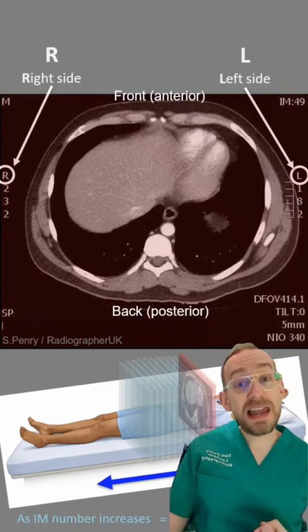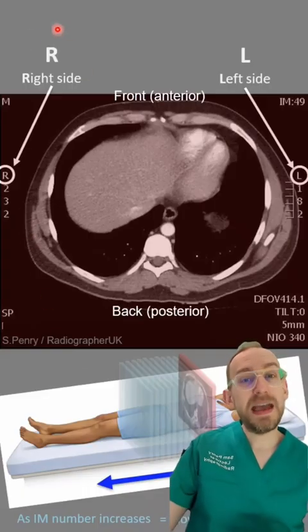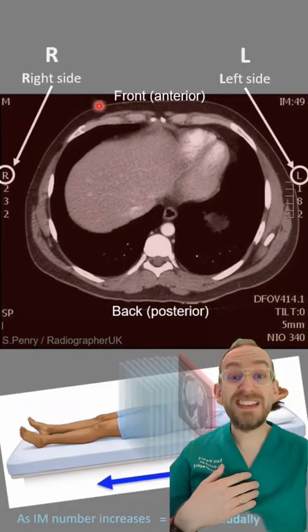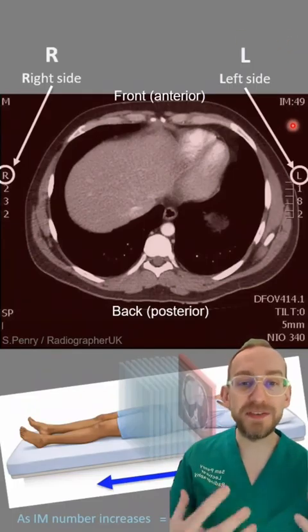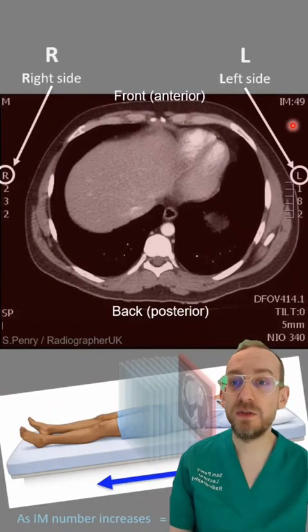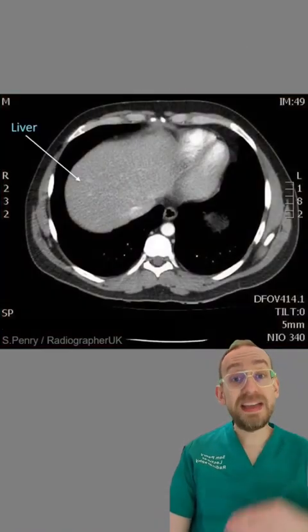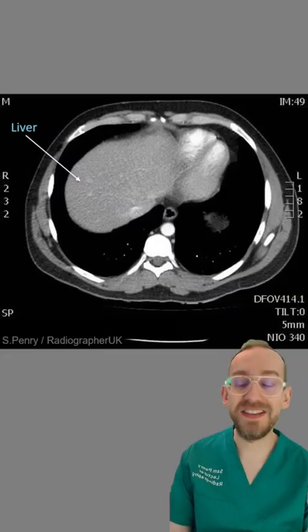Now, if we look at the left-hand side of the image, this is actually the patient's right side. So they're facing us. So our left is the patient's right, and the right of the image is actually the patient's left side. So we're looking at this almost back to front, okay? This applies to CT and many other imaging modalities as well. Now we're going to start at the very top of the abdomen, the upper quadrant, and then we're going to move down all the way inferiorly to the pelvis. So let's get started then.